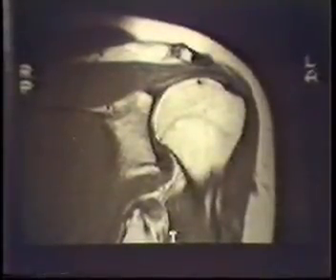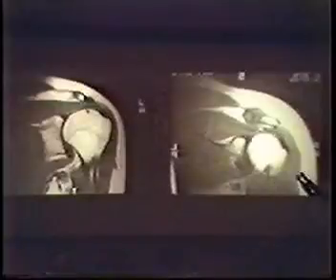Now, then you look at the supraspinatus tendon. It's too thick here. You don't see the nice planes that I showed you before. And in this particular patient, it's not black like it should be. It's still a little bit thickened, and it's not black. Okay. These are two patients that have impingement. And with impingement, with motion, you traumatize the supraspinatus muscle and tendon, and that leads to tendinitis. Tendinitis looks like this or like this. Areas of increased signal intensity within the tendon and some swelling of the tendon.